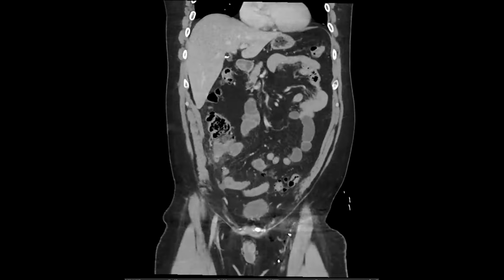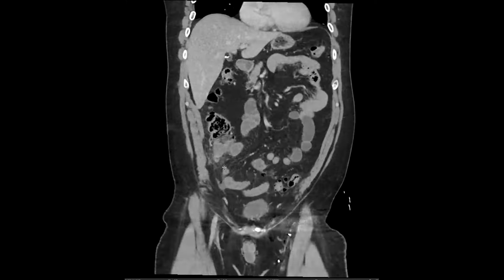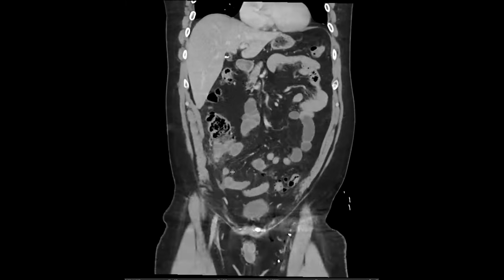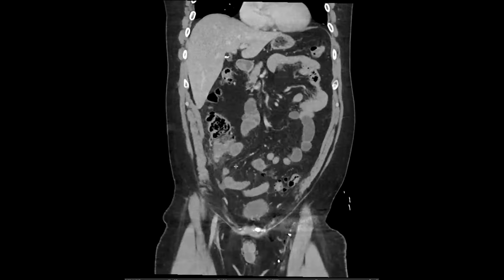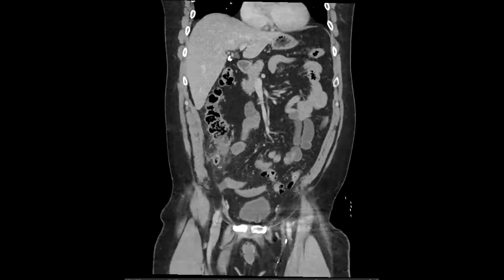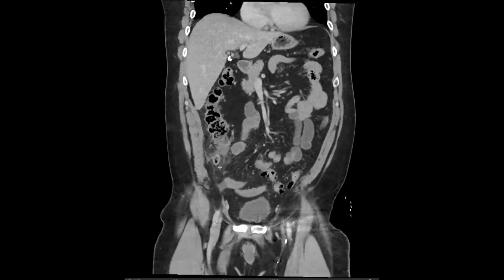Okay, can you repeat that? So if there's thickening of the base, it's default to appendicitis until proven otherwise. Is that what you just said? No, what I meant to say was, we always teach that presence of air within the appendicular lumen means it is freely communicating with the cecum, which means there is no obstruction at the appendix base, which means there is no appendicitis.